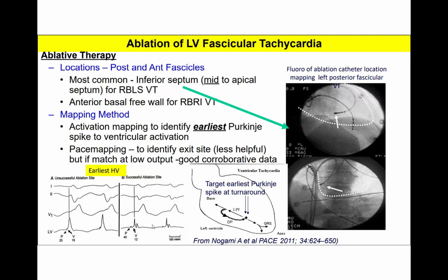But at the successful ablation site, the P potential is more clearly separated from our ventricular potentials. So this is much more a successful ablation site. Our target is to find this configuration, and we will be more successful then.